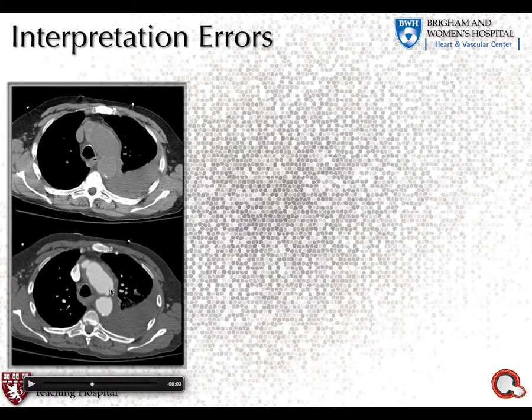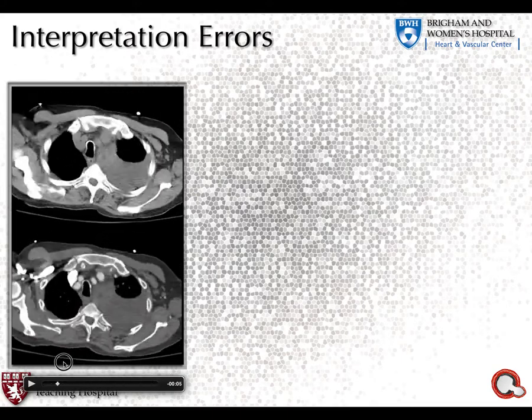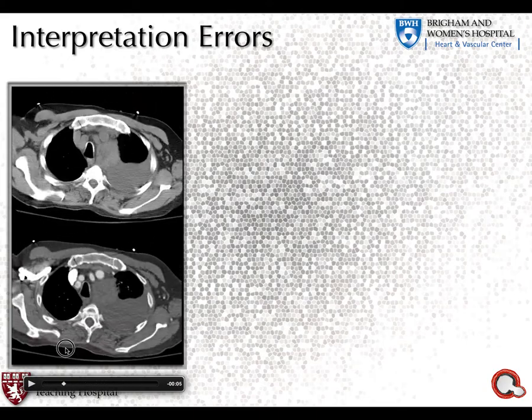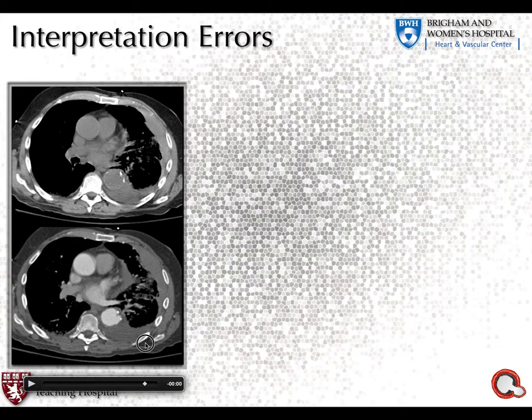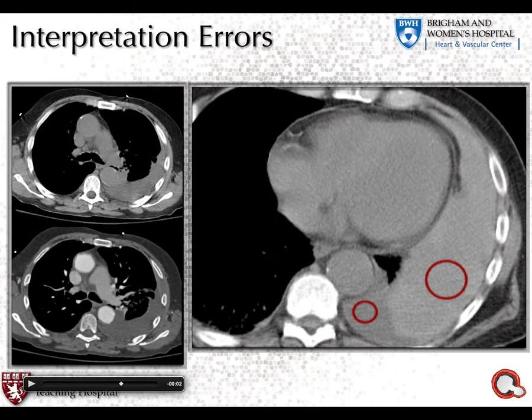How about this guy right here? Yeah. This is a ruptured PAU. Yep, associated IMH. What about the fluid in the chest? Well, let's take a look. That's where they measured. They didn't measure there. So they missed the hemothorax. I'm serious. This is a live case. This really happened, because they measured in the wrong spot.